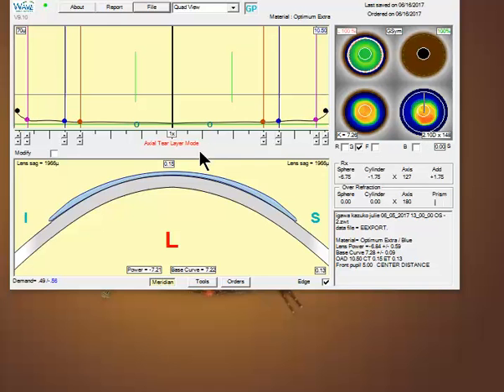When we look at your design, you've designed in axial mode, and this design looks very nice in the Wave software. You may recall that tangential design philosophy generally looks a little bit more precisely at this peripheral corneal data in the topography, whereas axial tends to look a little bit more accurately at the central data.